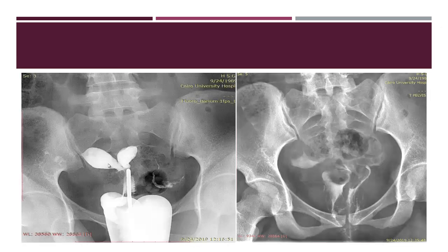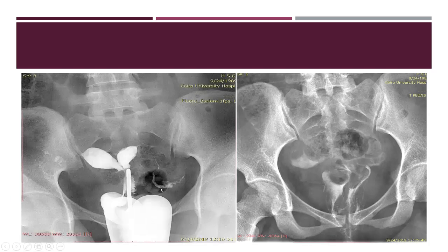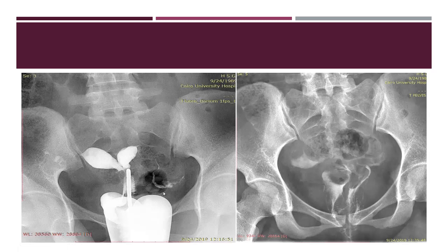This case, it looks like septate because it is an acute angle. But here there is also, so this is a duplicated cavity. In this case, it is a duplicated cavity. This is the plica palmata of the cervix, the normal, and this is the duplicated uterine cavity.